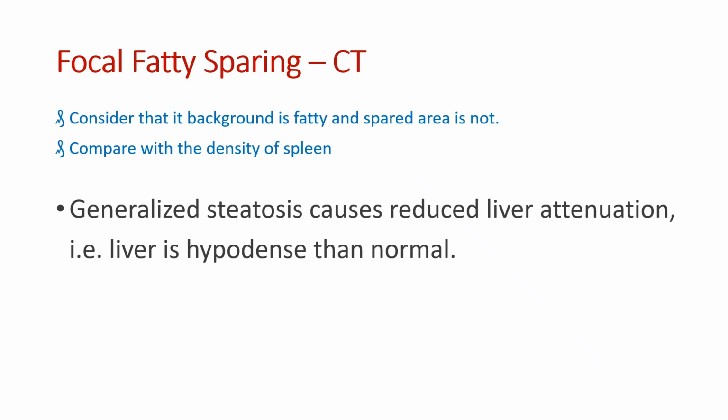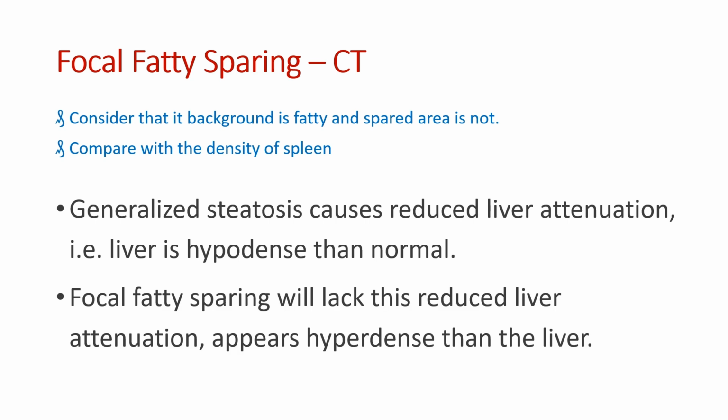In CT, generalized steatosis reduces liver attenuation. This means the liver is more hypodense than normal. Focal fatty sparing area will lack this reduced attenuation and appears hyperdense compared to the background.